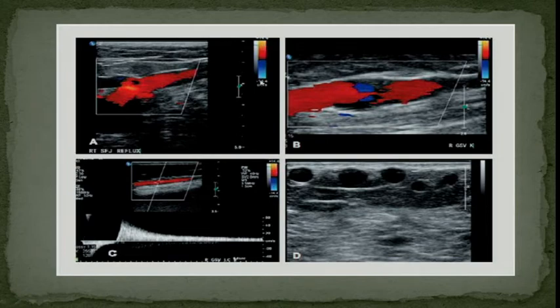Okay? If this is correct, this is correct. Apples grow on treetops, so red is on top. Water is in the ocean, so blue is on the bottom. If you remember this, you will know that this color bar is correct. So the techs have not manipulated anything. Any questions here?